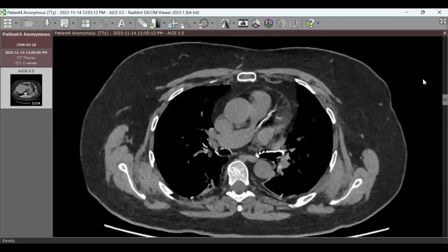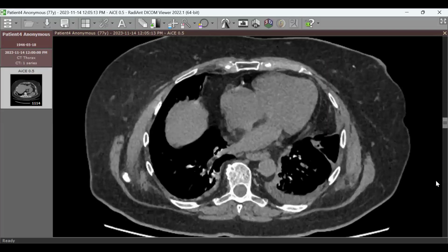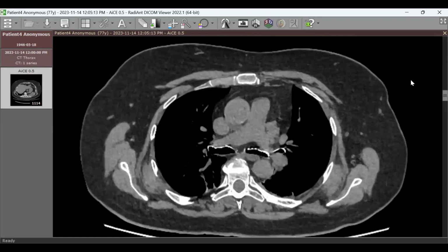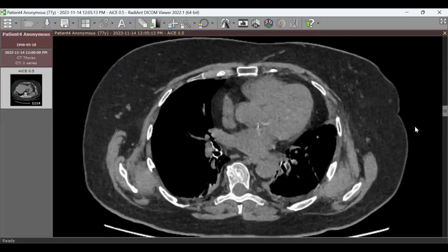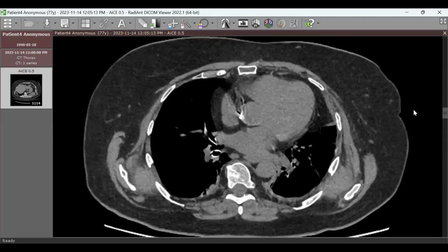In terms of acute aortic injury, the aorta itself. So yeah, we have some findings. These findings are on the non-contrast CT study and on the chest X-ray. As I mentioned, there is a left apical pleural cap. There is indistinctness of the aortic knob or the deviation of the trachea to the other side.